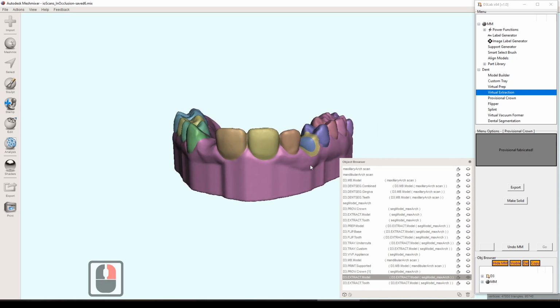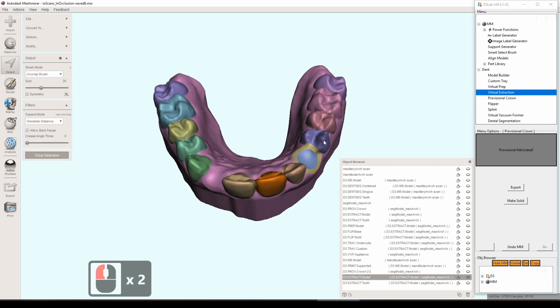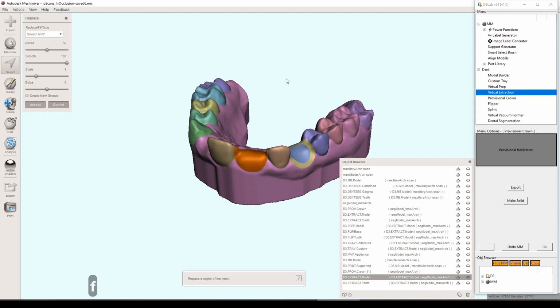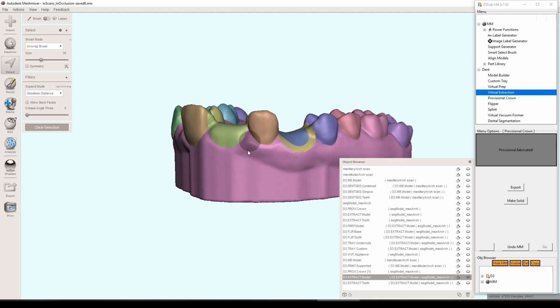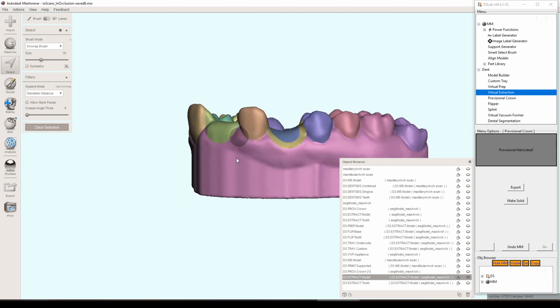There might be some other videos on YouTube of how to do extractions just with the select brush. You hit S, you double click, and then you can do something called erase and fill, which the short key for that is F. I'm going to hit F, and then yeah, not bad. You can tinker with this a little bit, and it's pretty good. In this case, it's almost as good, or arguably better. I don't know, maybe not, but it's almost as good as this.